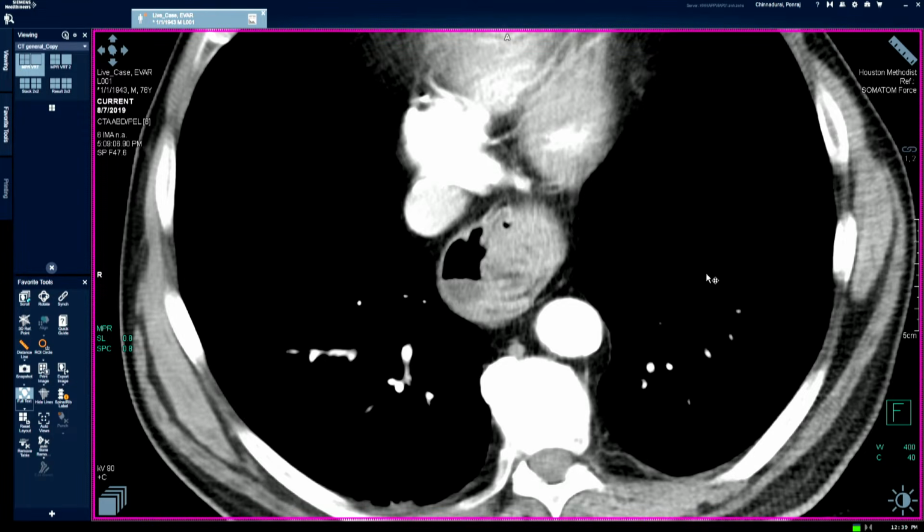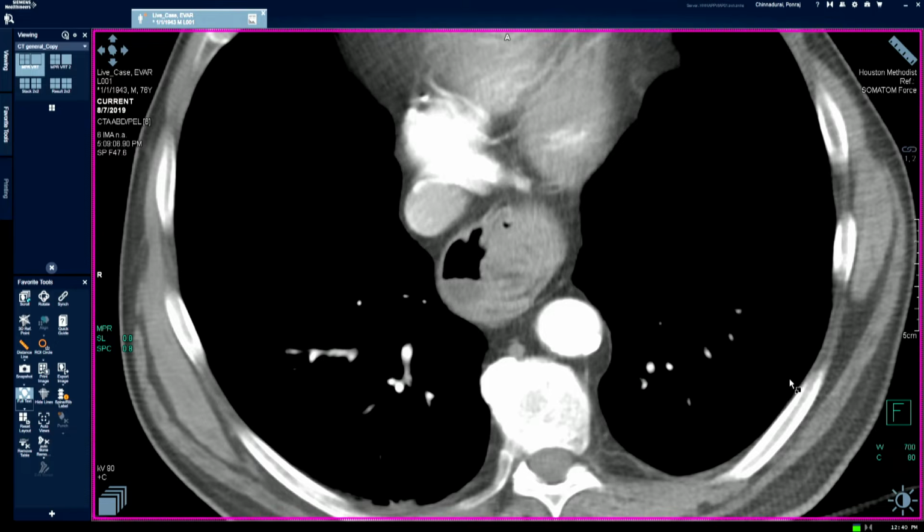Wasn't there a preset for angio up there? On the top bottom right? Yeah. So this is like it's not a very good preset window. We invariably have to manually window. Yeah. Why don't you fix that?